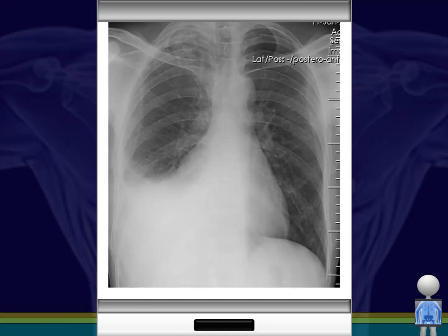And this is a case of a very severe pleural effusion, and I just wanted to share this with you to make you know that you can even have pleural effusions that take out most of the lung cavity on one side, even much more severe than what I'm showing you here, making it difficult, obviously, for that patient on that side to breathe because the lung space is being occupied.